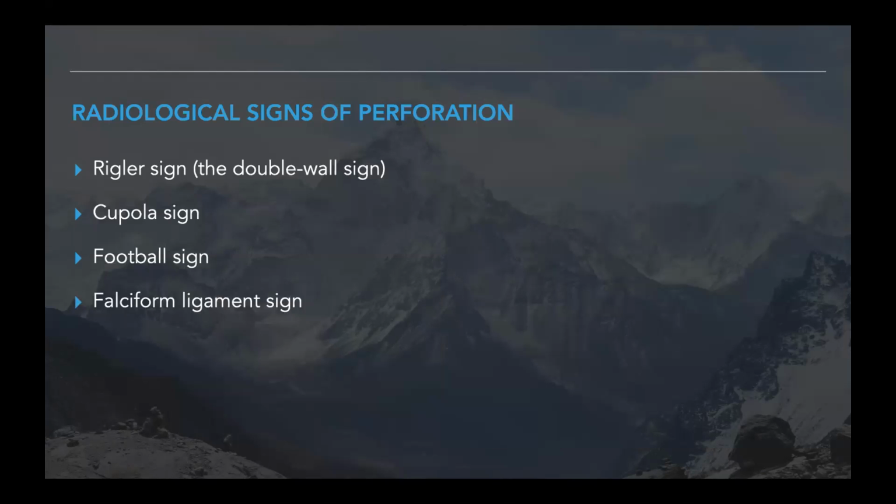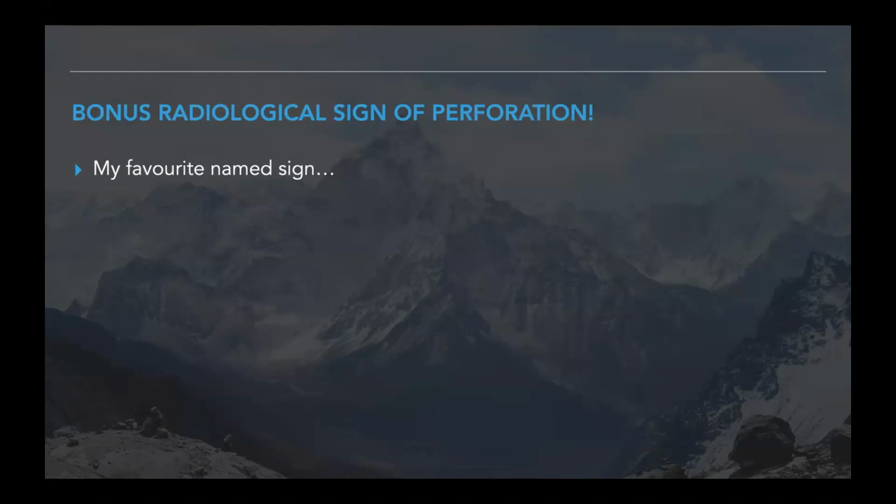Rigler's sign is certainly the most important and the one that you'll hear discussed most frequently. I'm going to give you a bonus sign here that you don't need to know about, but I'm just going to talk about it because it's my personal favourite radiographic sign.